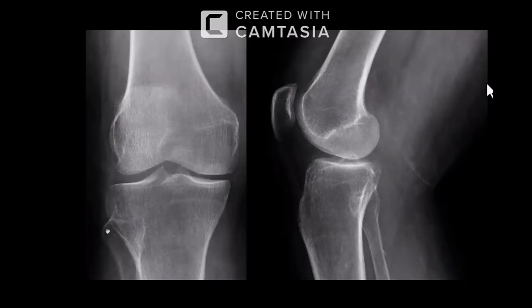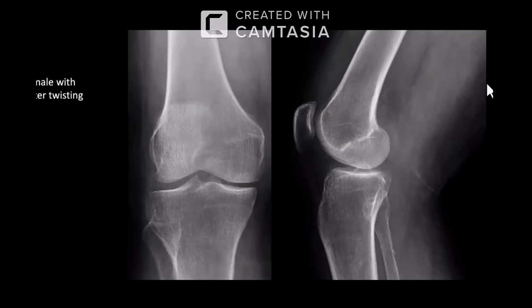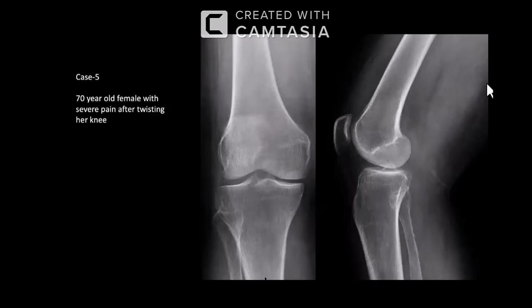There is some lucency overlaying the medial condyle of the femur, where I'm not sure whether it's just projectional. In my routine practice, I'll ask for MRI as I'm not seeing any definite abnormality on the X-ray. Okay. The MRI.